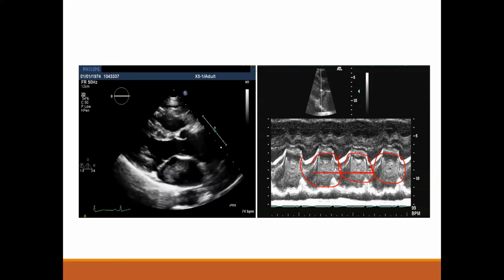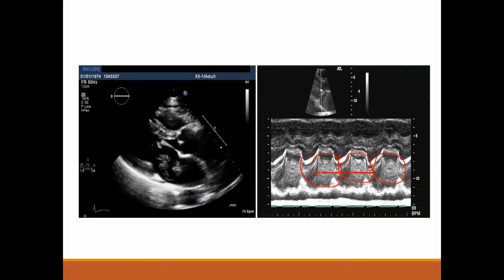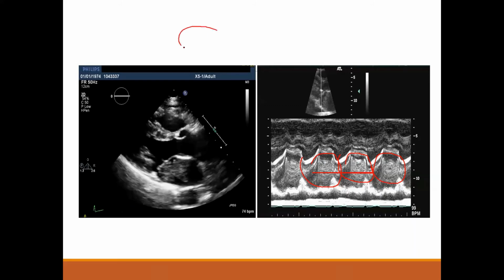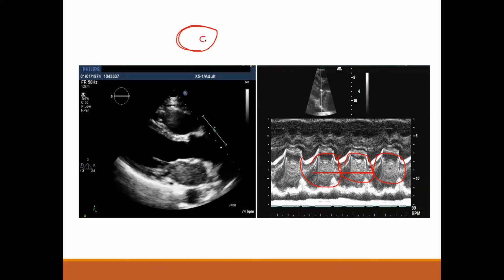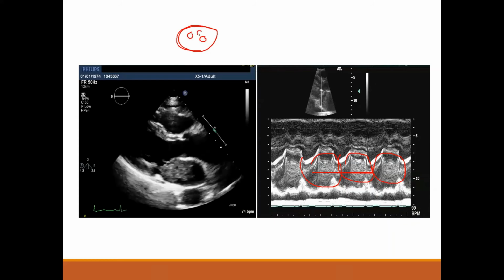So you describe it correctly, and it's good to describe the texture, and if there is calcification, you have to mention it. If there is echolucency, sometimes you see the mass, first you describe, is it regular or irregular? And then when you see some black dots in it, that means echolucency.